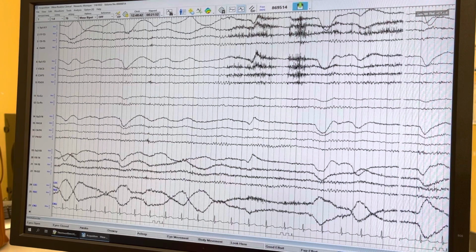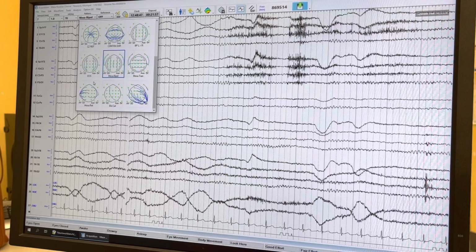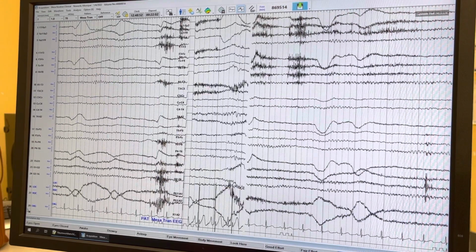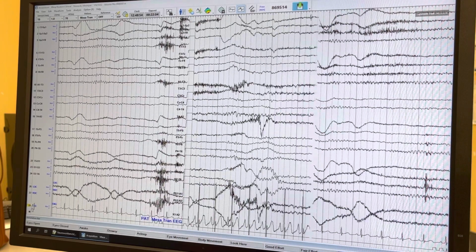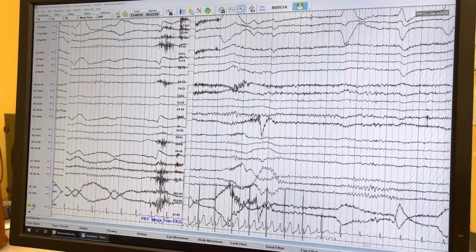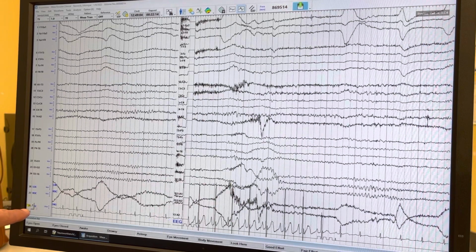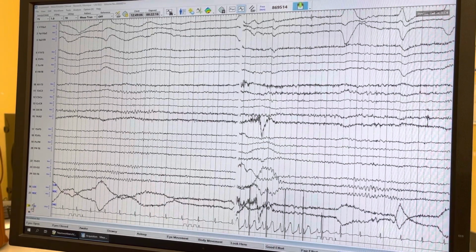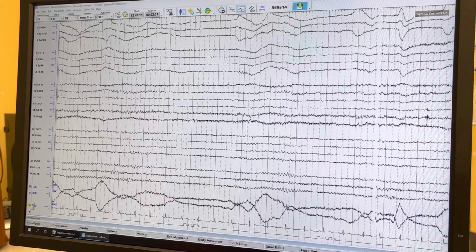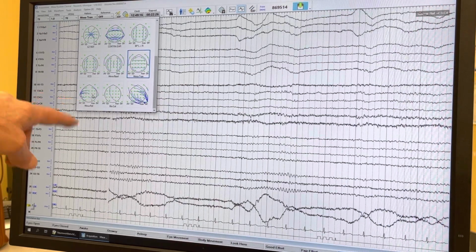Oh, and one other thing, just to change the montage, it's on the bipolar. So you click down, and then here's the transverse. So here we're on a transverse montage. Now I just lowered the sensitivity in the EEG by clicking on this here and then doing the negative symbol, and then here's the reference right here.